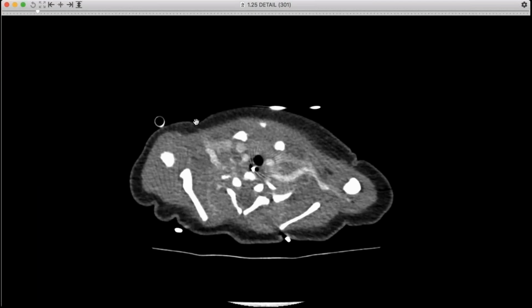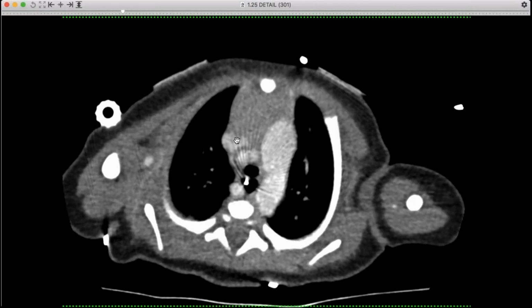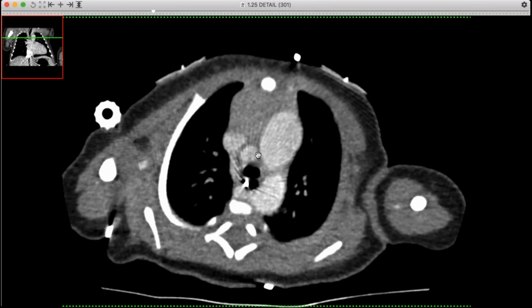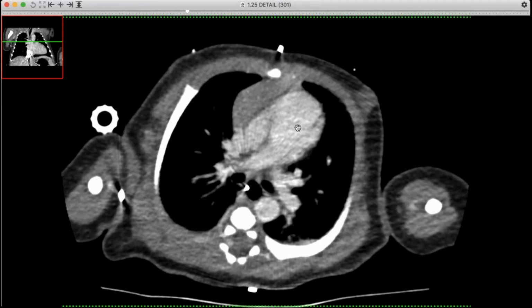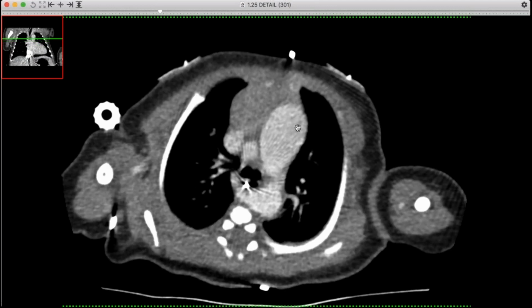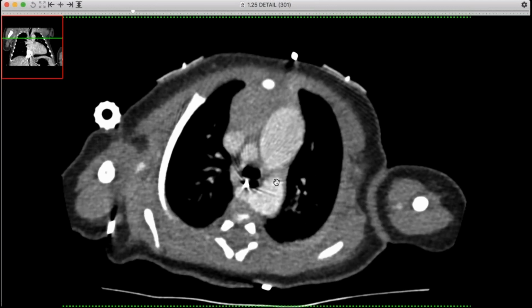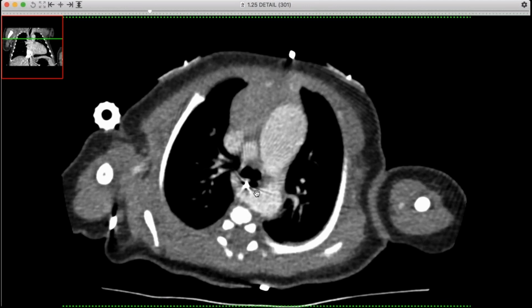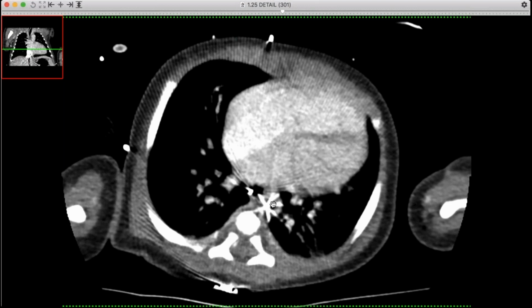But what's cool is the CT scan. So they did an echo, it was abnormal. And so we're going to see a couple of things here. First, we're going to see this: there's the pulmonary artery, very large. There's the patent ductus right here, and it communicates over with the descending aorta. There's a balloon pump in at this point.